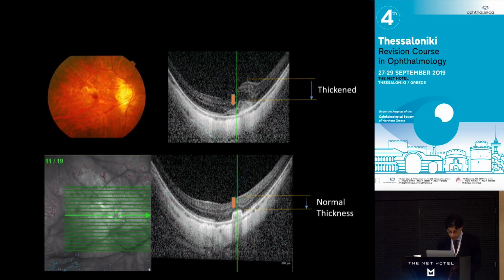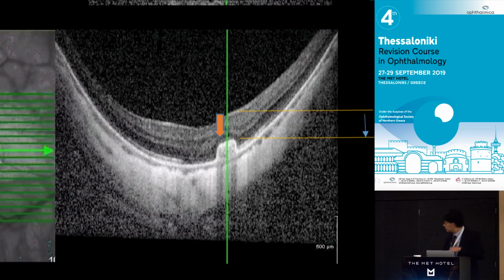Oops, can I zoom in here? So the endpoint of treatment, which is the RPE growing above the CNV complex, really well-defined border, and that just sits there. It will not go away. And sometimes, with a bit of luck, your ellipsoid zone will actually reform above it and you'll have pretty good vision. It'll still have distortion, but that is your endpoint there. Yep.